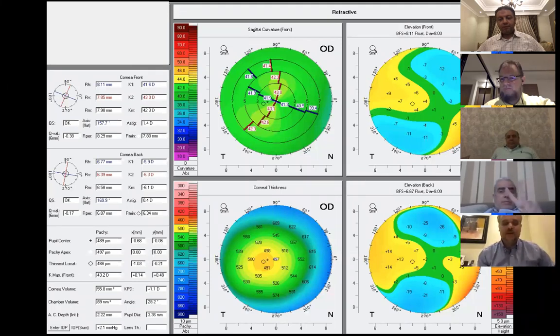The first consideration is that this Pentacam shows there is no keratoconus in this case. It is symmetric, there is astigmatism, and we can supplement with other examinations like biomechanics or epithelial mapping and be sure that it is not keratoconus. The second thing, for the right eye, it is not +6, because we have a small minus astigmatism of 0.75. So if we convert to plus astigmatism, we will have +5.25 for sphere.